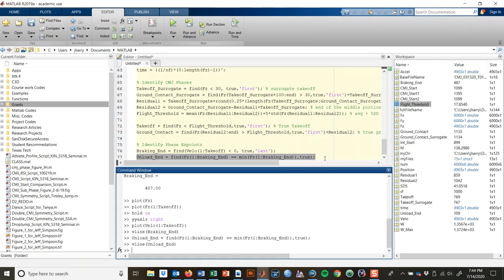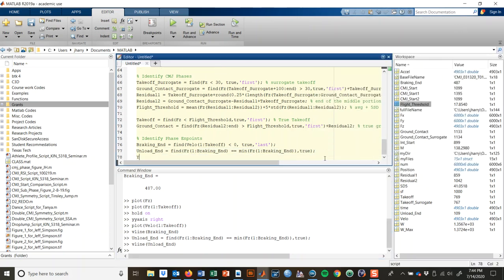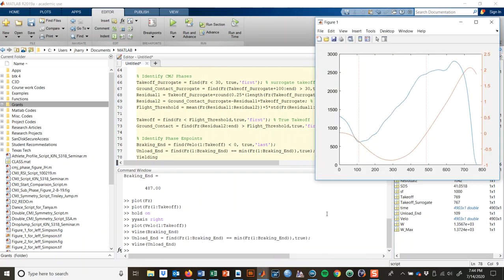Back to our purpose. But there's another phase here that we've recently defined as eccentric yielding. Now the eccentric yielding phase is the time period where you are increasing force. So there's a positive rate of force development, but that positive rate of force development, or that effort to start slowing down, doesn't change your velocity at all. You're still increasing your downward velocity, so you're getting faster. So this period of time while you have a positive rate of force development and increasing negative velocity, that is a yielding phase, or an eccentric yielding phase if we want to call it that.